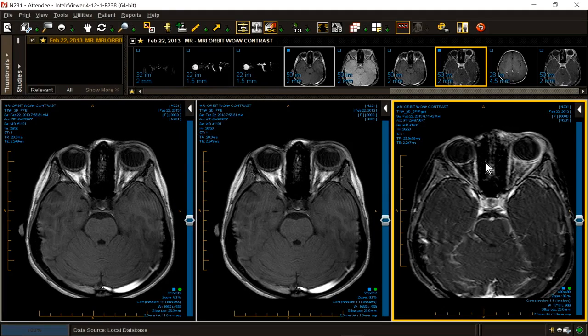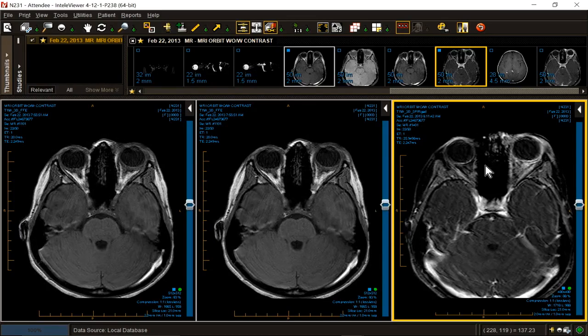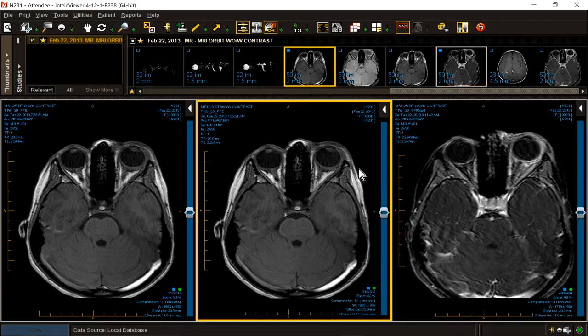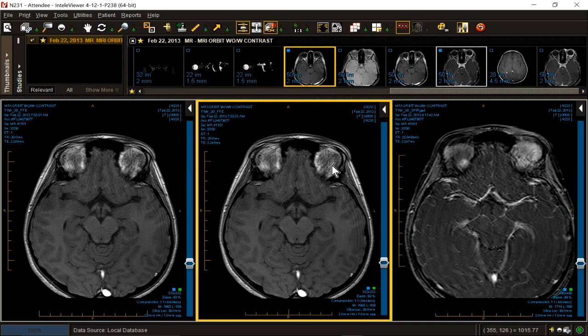You might say, well, okay, how about lymphoma? But lymphoma is bulky. It's a mass. It diffusion restricts. Yes, lymphoma can be infiltrative elsewhere in the body, but still, even elsewhere in the body, it tends to be bulky. But that would have to be in your differential, although the process is bilateral. So you have to think about something that could be bilateral. Another tip-off, potentially, to the diagnosis of this difficult case is the left lacrimal gland is swollen relative to the right. And it enhances with inflammation around it.